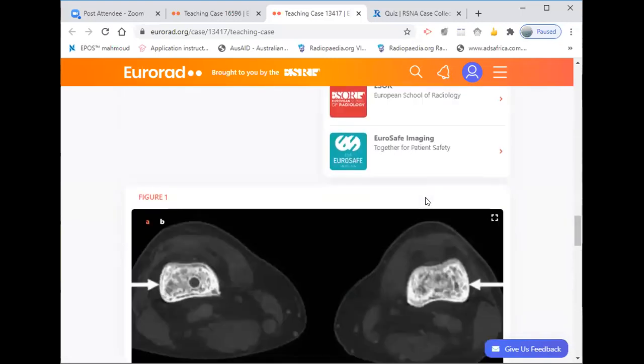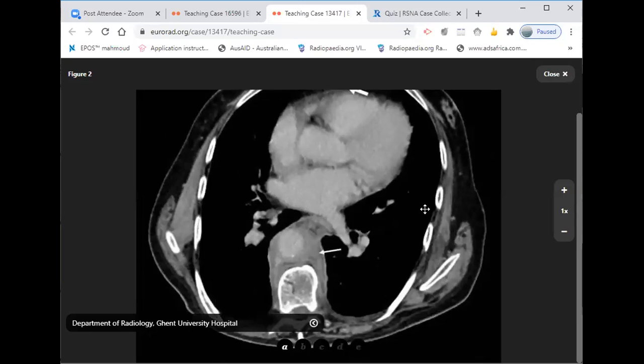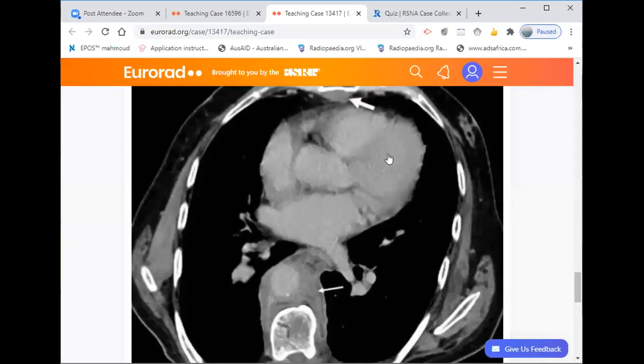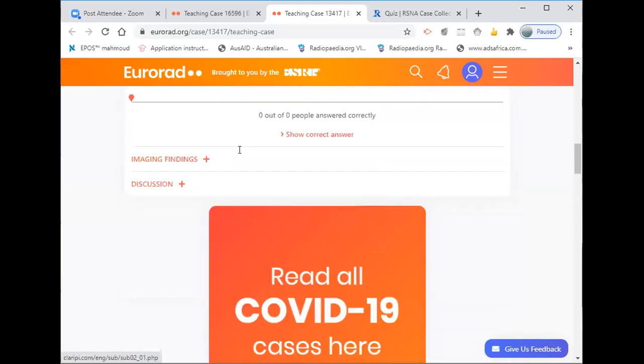So before we go to the, yeah, you want to check the kidneys, okay? But the kidneys don't appear in this selected image. Okay, why Erdheim-Chester, why? So before we go to the final diagnosis, let's try to collect the image findings we find.